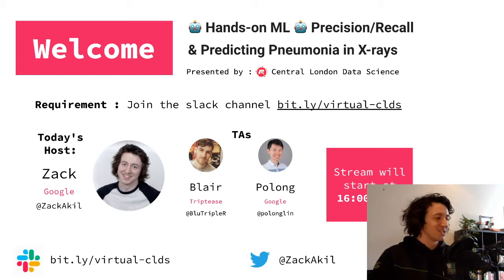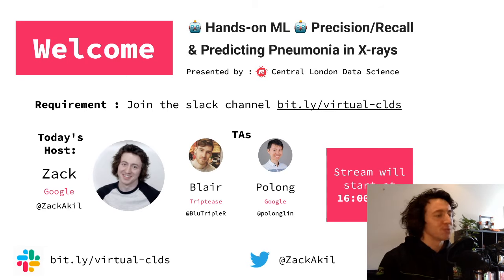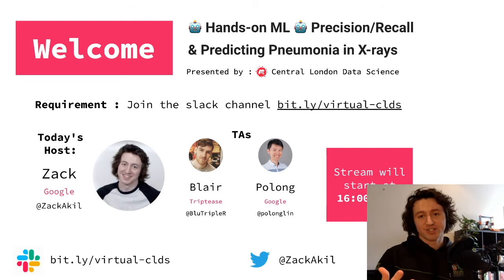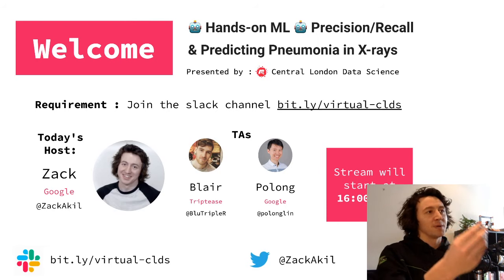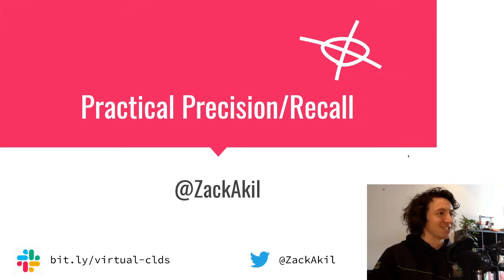We're all here to learn about precision recall and pneumonia, hopefully. We're running this like we do our normal meetups. We assume beginner level knowledge, but we're going over some topics that even senior data scientists get confused with. Precision recall is a very wordy topic, and there are a lot of easy ways to get mixed up. So we're going to go gently through all that and do some practical implementation of it by trying to predict pneumonia in X-rays. So let's get started here.